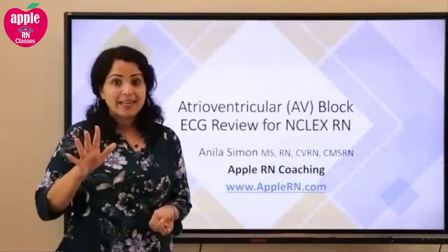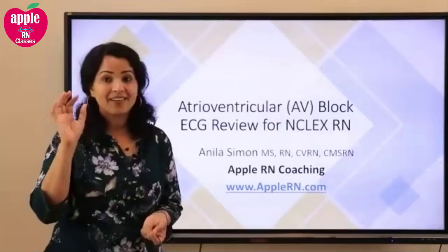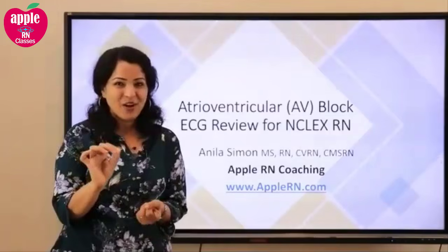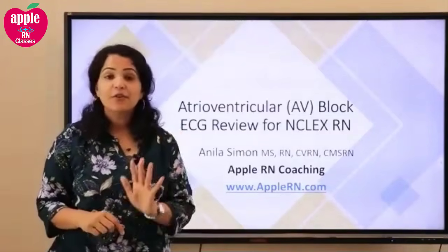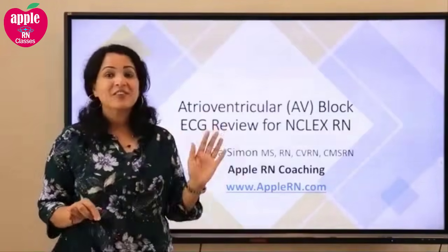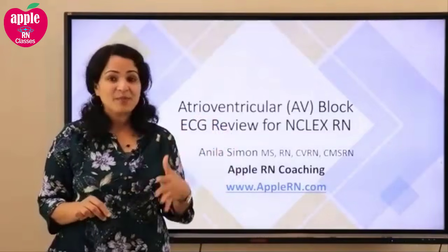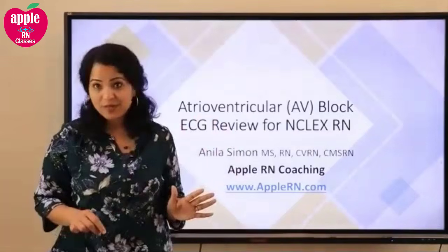I just wanted to focus specifically on this one, atrioventricular block. Even if you don't know anything about it, you'll be happy you attended this session, because by the end of it, you will be able to interpret it.